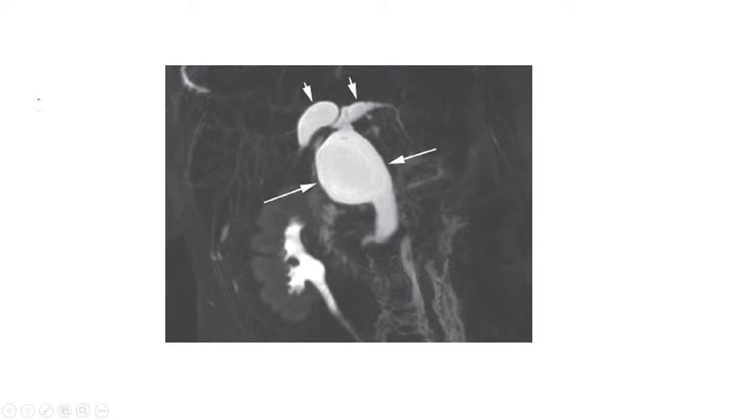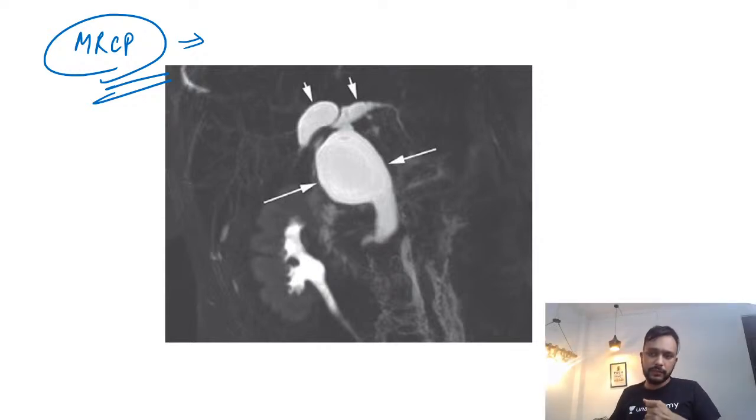Another important MRCP image, guys. Anyone? What are we able to see on this MRCP image of the abdomen?